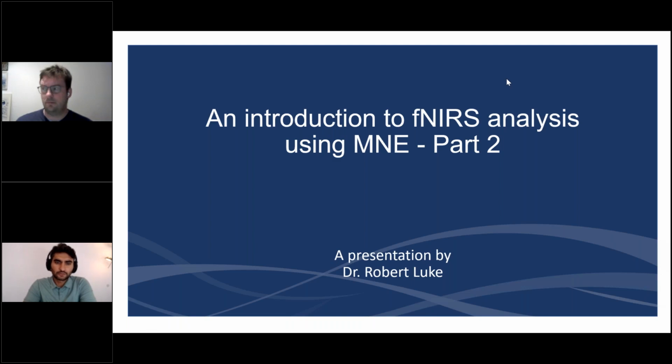Very quickly, in the previous webinar, we looked at some of the basics of the MNE toolbox. Rob took the example of NIRx data and showed us how to load and visualize the data, as well as walked us through some of the pre-processing steps. And we did some statistics in the end, not too much though. In the second part, Rob will do a deep dive, if I may say, and talk about GLM as well as group level analysis.